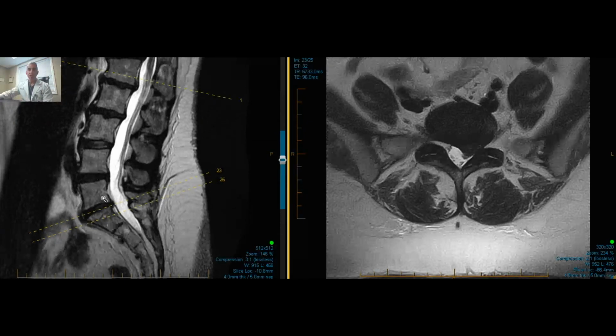The nerve that comes out the last disc here in your low back is referred to as the S1 nerve root, a big contributor to the sciatic nerve. This would be the nerve that travels down the back of your leg. So when she told me she has pain that runs down the back of her leg to the calf, this correlates very nicely because this is exactly where the nerve goes. Comes out this space here, travels down the back of your leg, and your calf muscle is controlled by this, which leads to the movement of your foot.